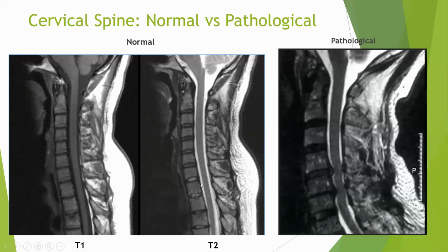Look at the huge fat pad at the cervicothoracic C7-T1 junction, a lot of thick fat pad, which means this individual probably has a hump called the Dowager's hump. Dowager's hump right over here, as you have seen.